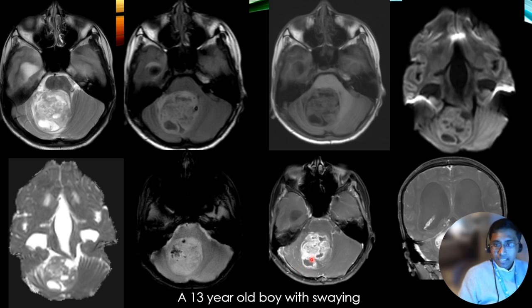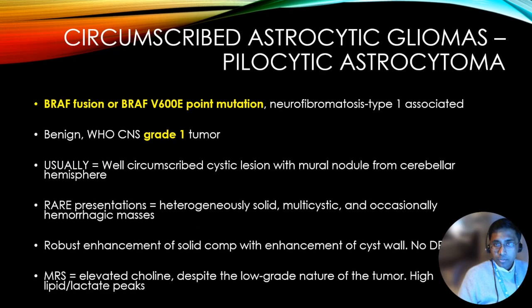So when you have an intensely enhancing mass in the posterior fossa which is quite bright in T2 and which is not restricting, in a child our differential would be pilocytic astrocytoma, and the same thing in an adult we would think of hemangioblastoma. But this is a 13-year-old boy, and pilocytic astrocytoma is typically how they look. So remember, in pilocytic astrocytoma, as I showed you in my second slide, we could either have a BRAF fusion or a BRAF V600E point mutation, which are the two most common associations. They are associated with NF1. It's a WHO grade 1 tumor.